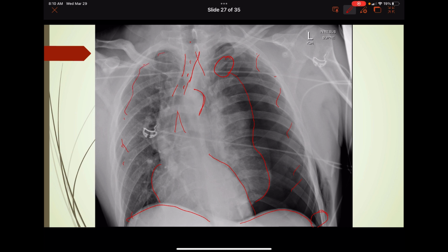So this patient has a tension pneumothorax, and again needs finger thoracostomy followed by chest tube, or if you don't do chest tubes, do a needle. I tend to go right to a finger thoracostomy. It's quick, 100% effective, and you can do a chest tube anyway. If you don't do chest tubes, you can consider needle thoracostomy, and do the axillary placement now instead of the anterior placement, as it is more effective.